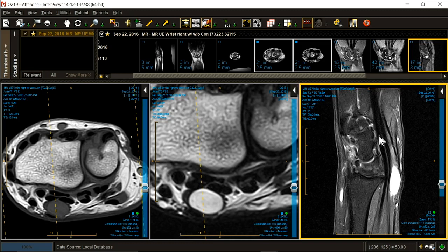A vein? It would be a varix. An artery? It would be an aneurysm. A nerve? It would be a nerve tumor. And we are connecting it to a nerve, the median nerve. There's the tail. So the diagnosis is simple. It's a median nerve schwannoma. How do you know it's a schwannoma? Because 95% of all peripheral solitary nerve sheath tumors are schwannomas, not neurofibromas. So you can guess.